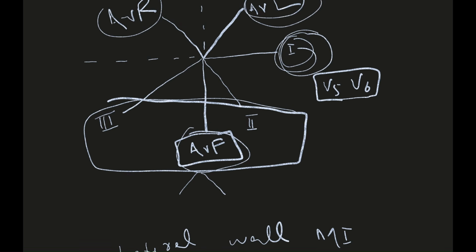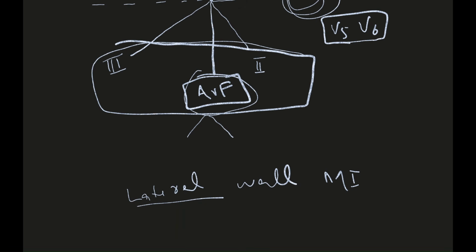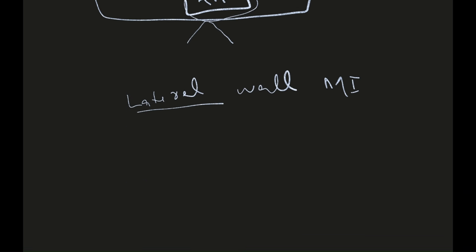And then remember, precordial leads are placed over the chest. If there is an anterior wall MI, the anterior side of the heart is being faced by V2, V3, V4. These leads basically face the anteroseptal area. So the changes will be evident in V2, V3, V4 in anteroseptal MI.